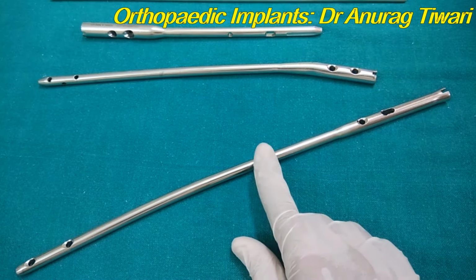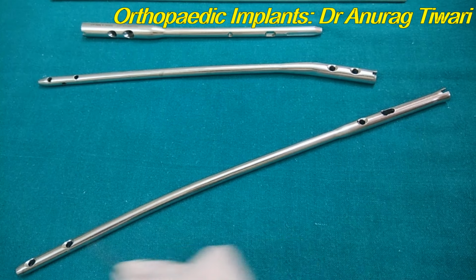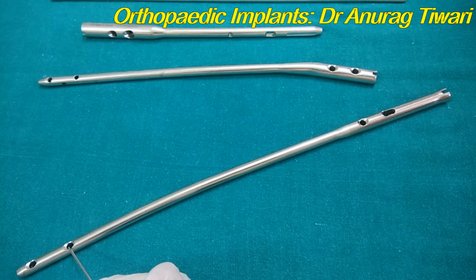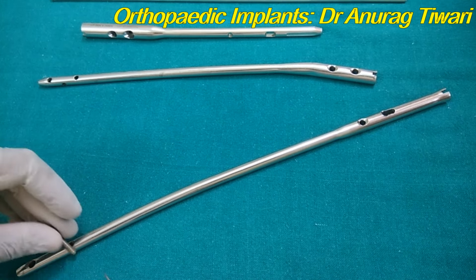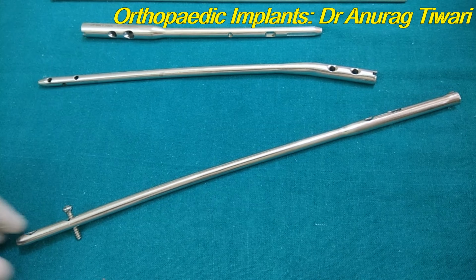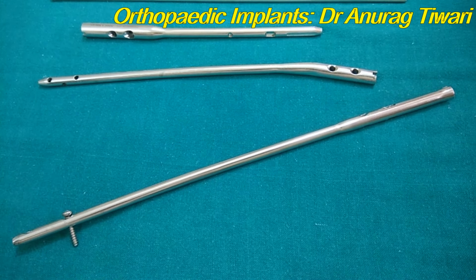Now this is the interlocking nail because it has two holes in the proximal fragment and two holes in the distal fragment for interlocking, because the screw can go through these holes and fix the bone with the nail. So this provides rotational stability. Now the nail is not going to toggle. Now the nail is not going to rotate. So this provides the rotational stability.